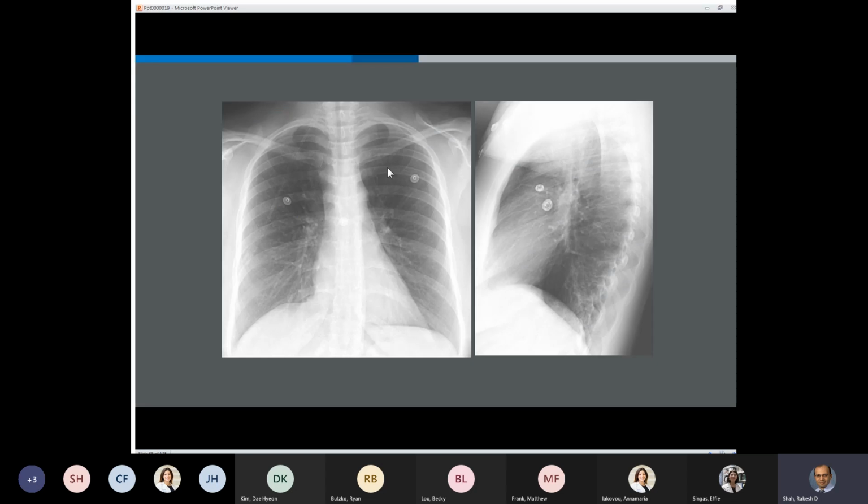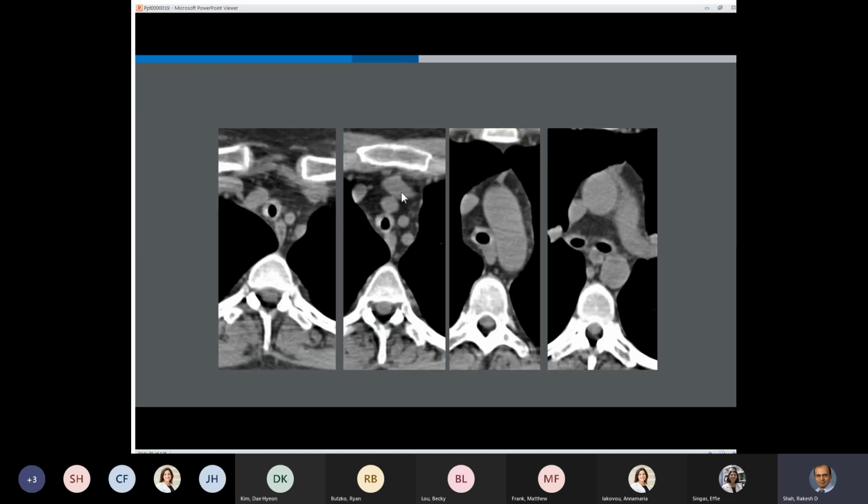Here's a different patient. You've seen x-rays, but you've never seen the airway so narrow. Clearly it should be much wider. This airway is very, very narrow, but it's diffusely narrowed. If one were to do the CT, they would see that the wall is thickened laterally and anteriorly, but the posterior aspect is spared, and it goes from top to bottom.